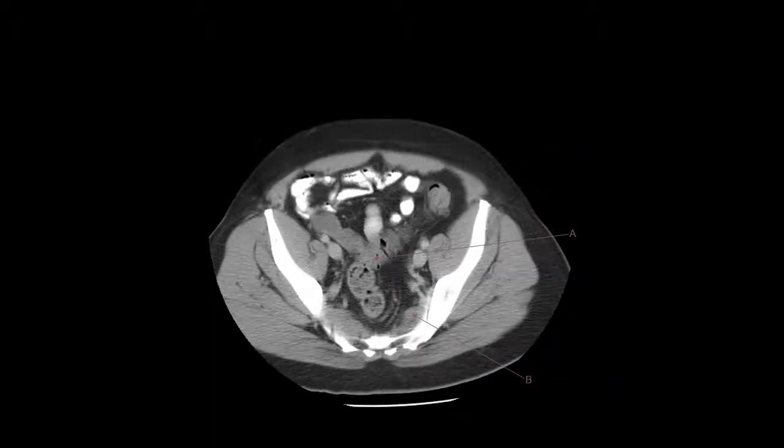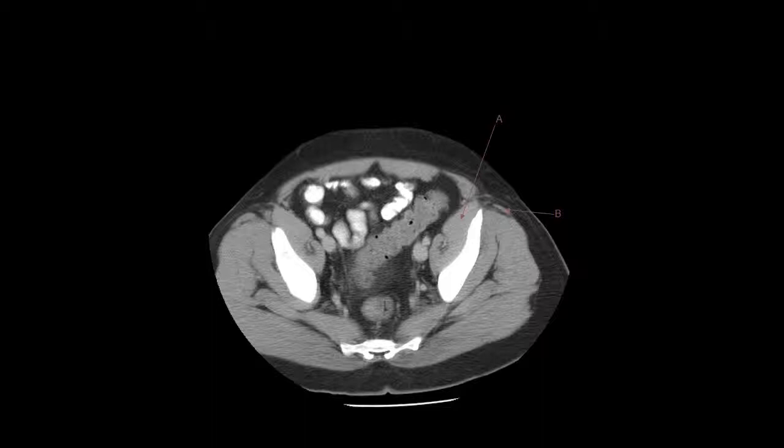All right, A, what are we pointing at here? Well, I see a lot of stool here that looks kind of dry, and we're down at the sacral level, so think about what that might be. It is, in fact, the sigmoid colon. All right, we've come across from the descending colon. Now we're getting near the rectum, and that's the sigmoid colon, as it does its S shape, essentially, as it comes down. And then you got your piriformis muscle coming across there.